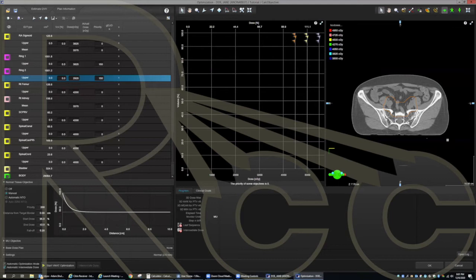It goes up to, I think, 60 instead of 40, and this is a much shallower fall off. So usually it falls off much shallower. Okay. So I've made this quite steep and very close to the PTV. Yeah. So it's a lot sharper and closer than when it automatically comes up. Yeah, sometimes it starts from 1 cm even. Yeah, I think you're right.